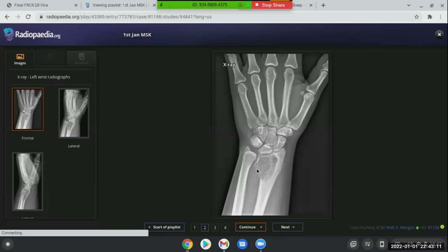And this was GCT. So basically GCT and ABC are diseases of the same spectrum. Sometimes we can also see fluid-filled cysts when we do the CT scan of these patients. So it's the same spectrum. This was GCT. You did really well. Thank you, Doctor.